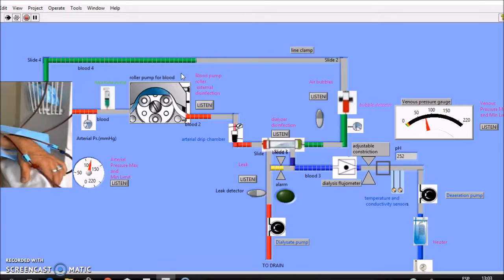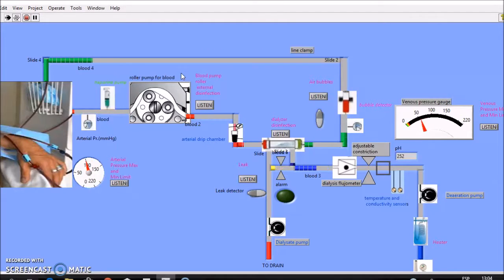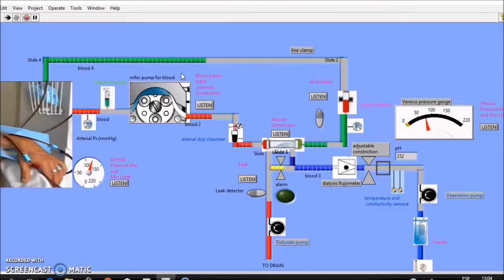The delivery system prepares dialysate and delivers it to the dialyzer. Then the external blood delivery system, the extracorporeal blood circuit, circulates a portion of the patient's blood through the dialyzer and returns it to the patient. Usually, an artery and a vein in the patient's arm are surgically joined for circulatory access. This junction is called an arteriovenous AV fistula.